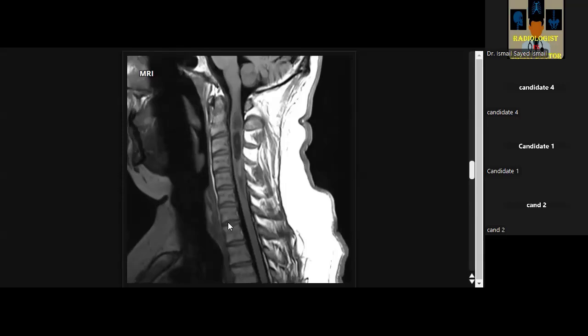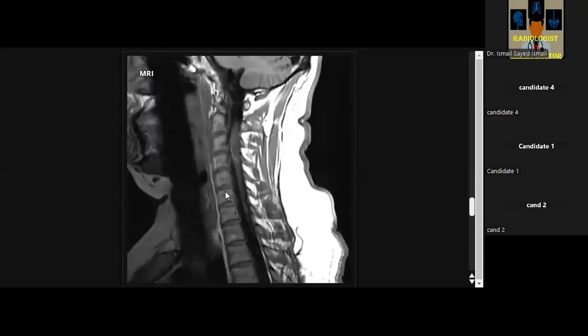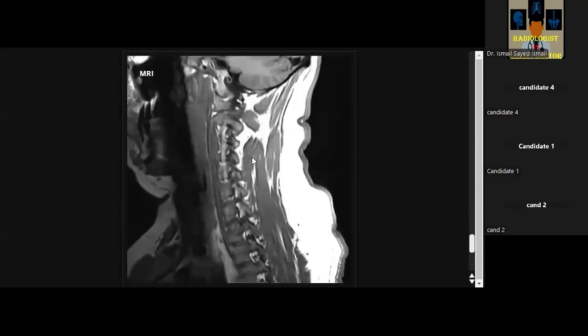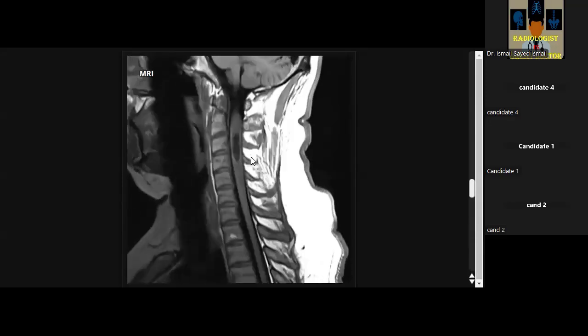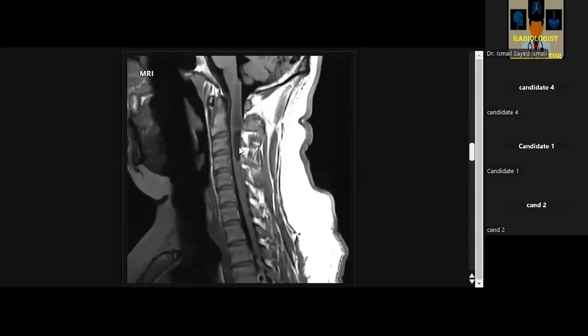There is straightening of the normal cervical lordosis. The vertebral heights and signal intensities are a bit reduced, but to make an inference, I'll have to compare with others. So my finding in this image is that of an expansile intramedullary lesion with adjacent edema. I would like to check this on a T2 sequence as well as on T1 plus contrast. I will show you the T2 now.